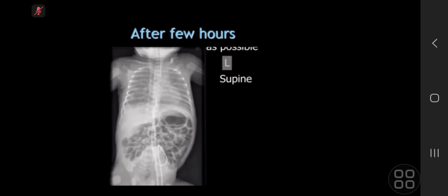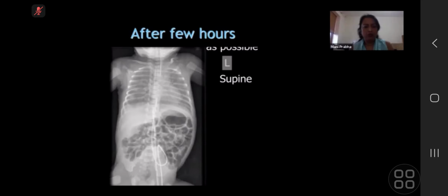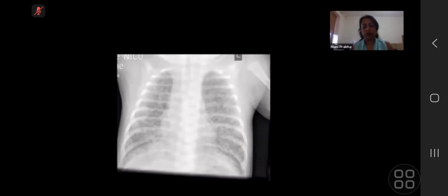Okay, and if this is the same patient, so this is a babygram, and just concentrating on the lungs, there remain some granular opacities, but the patient has now been intubated. There's an increase in the lung volumes, and some branching interstitial lucencies suggesting a degree of pulmonary interstitial emphysema formation. I could comment on the tubes and lines as within my general practice. Yeah, sort of normal, so we'll leave that.